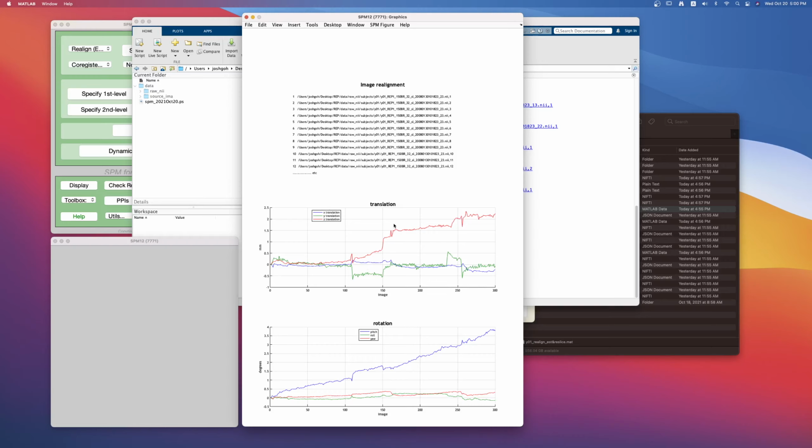So just by looking here, we can see this subject is okay. There's a big movement here in terms of the inter-session scans. But within session, this subject hardly moved more than 2 millimeters or so. So I'd say this is okay. Even in terms of the degrees, although it went from 0 to 4 degrees, we generally use the same kind of number in millimeters as well as degrees. So if it's 3.4 millimeters of movement for translation, we also use a similar 3.4 degrees of rotation.